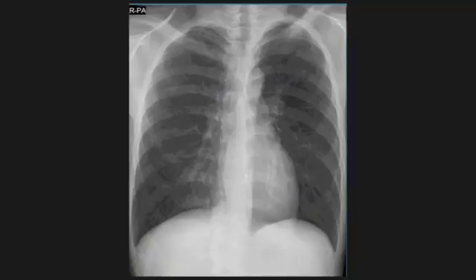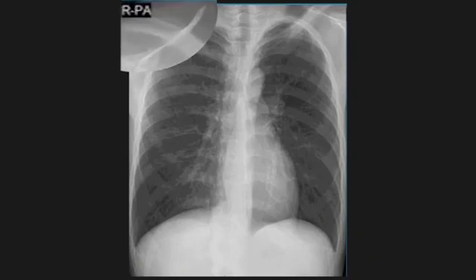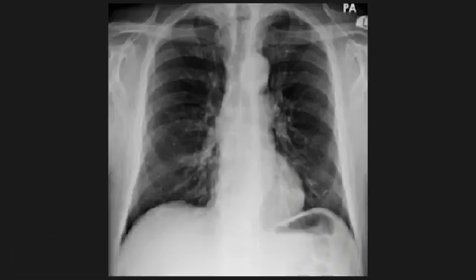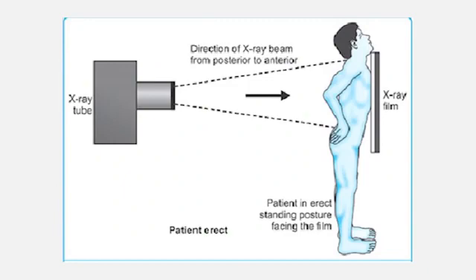in ICUs. Radiographers will often label a chest X-ray as either PA or AP. So if the image is not labeled, then you consider it as PA. That is a PA view, right? If you are not sure, then look at the medial edges of each scapula. In order to take a PA view, the patient places his or her arms around the side of a detector plate or stands with hands on the hips, as you can see in this diagram. This ensures the scapulae are rotated laterally and no longer overlap the lungs.